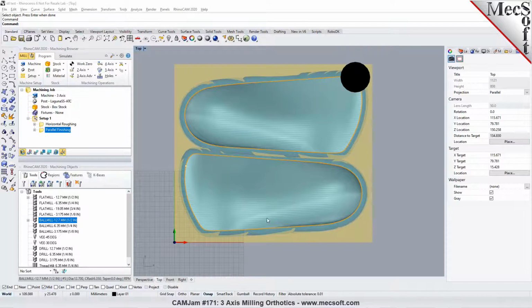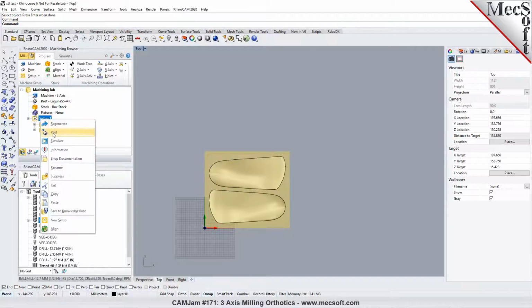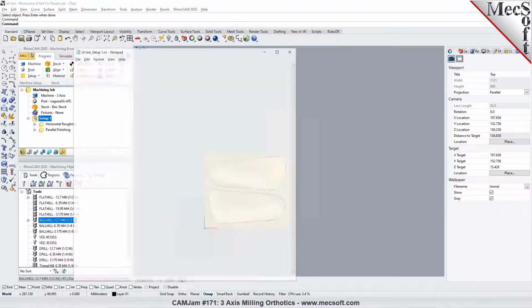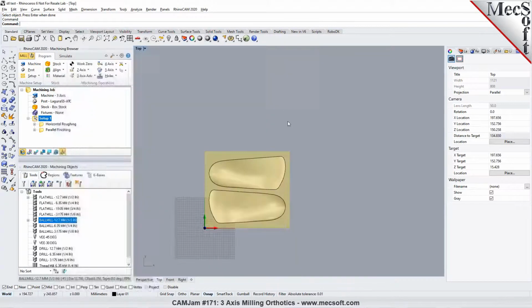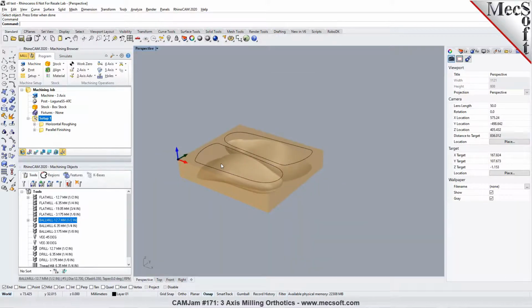Yes, you can program like 10 different scans into one sheet, and you can program them all together, and you can run it, and you can do a post process here, and all of those will be output in one job. In this example, we only picked one pair, but if you wanted to do multiple pairs, you could do that as well. So you just have to lay them out within your sheet at a stock dimension, and then you can program multiple parts at once.